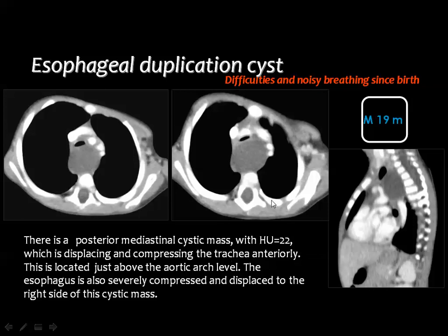You know that cysts in the mediastinum can show the 7 criteria of simple cysts all over the body, including 3 positive and 4 negative criteria. The positive criteria are clear fluid content, paper thin wall, sharp well-defined margin. The negative criteria: no septation, no calcification, no mural nodules, and no contrast enhancement. But sometimes you may see in the mediastinal cysts some internal septation, and also you can see flecks of calcification.